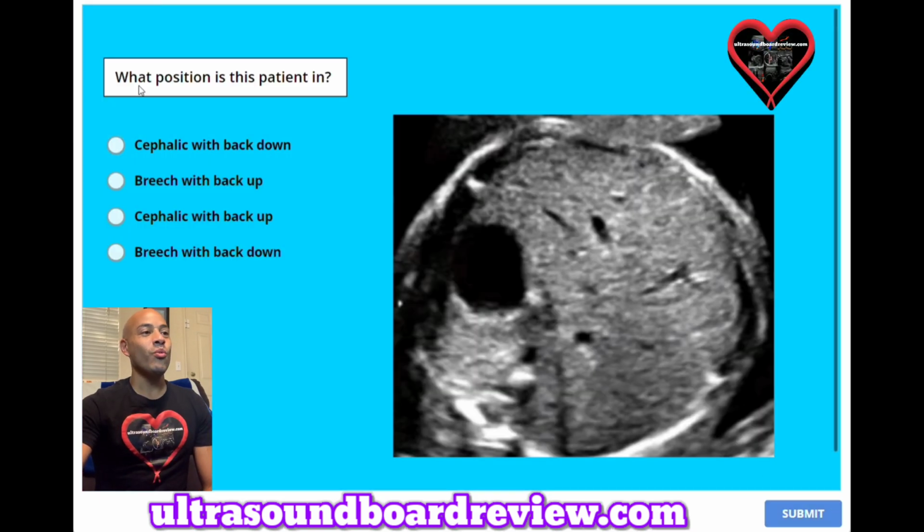Question 13. What position is this patient in? A. Cephalic with back down. B. Breech with back up. C. Cephalic with back up.